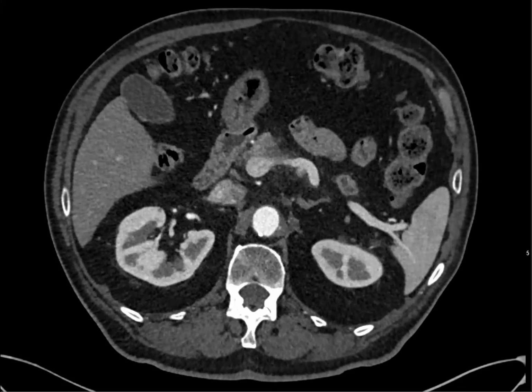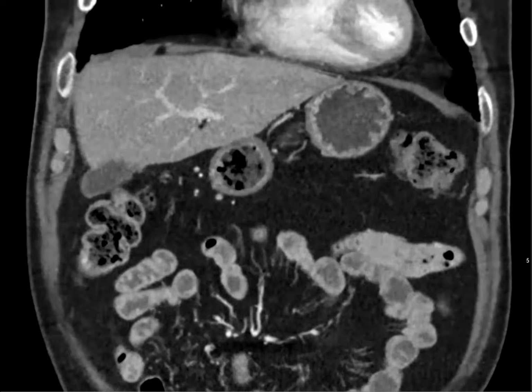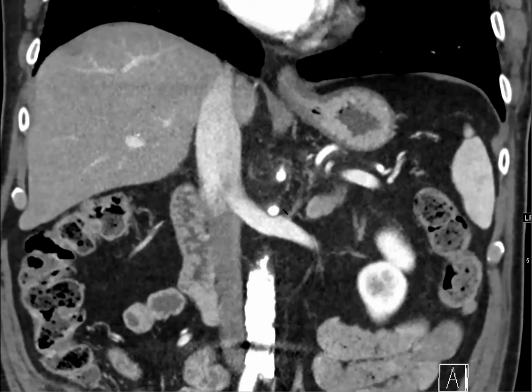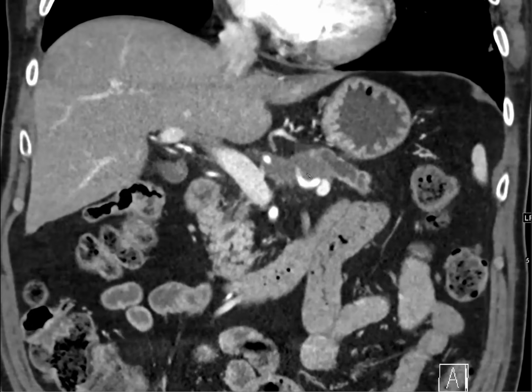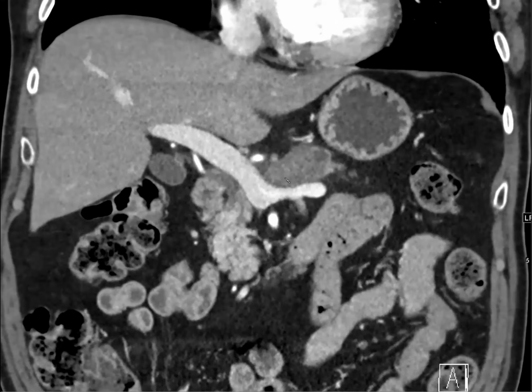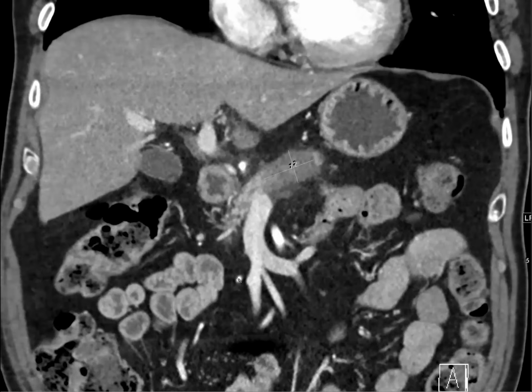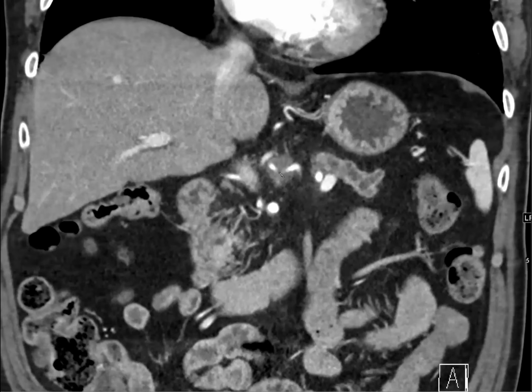So what surgery can the surgeon do? Anyone? So they can do an Appleby procedure, which is basically a distal pancreatectomy with resection of the celiac axis. But the only way they can do that is if you have an intact GDA, and even better if you have a replaced hepatic artery arising from the SMA. So the problem with resecting the celiac axis is that you need your hepatic artery. You don't need your splenic artery, you don't need your gastric artery, but you do need your hepatic.